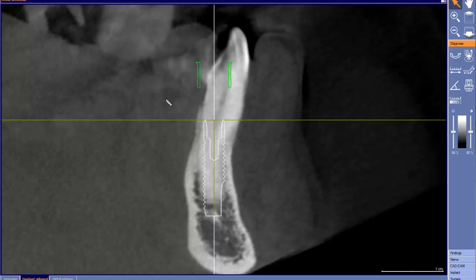One of the things I always like to do, and I'm not saying you visually need to do this, but mentally, is go ahead and draw out what appears to be my bone, and then draw out my tooth. That's a rough drawing. And now what I'm able to see here is the area of bone that we have.